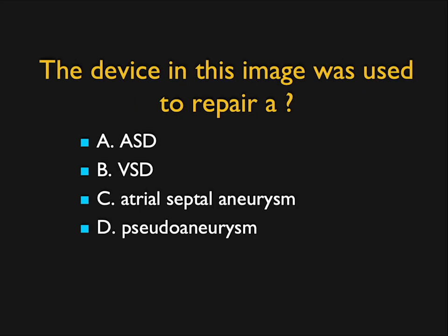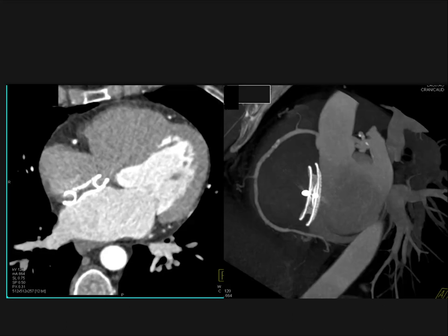This is a wonderful case. When you look at the images, you see this quote-unquote foreign body, and then I ask you, what is the device? It isn't there accidentally. And what's it used to repair?